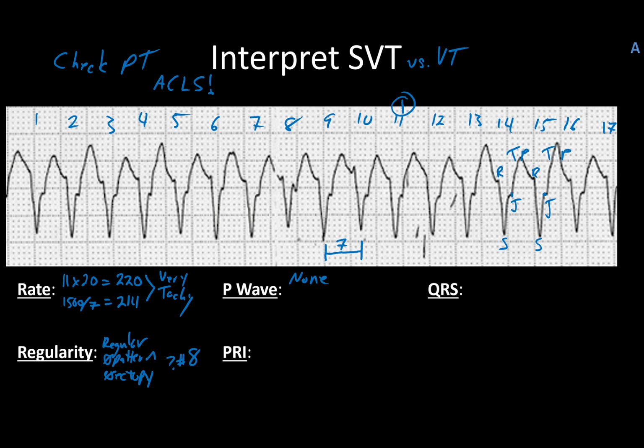However, if you look closer, there is some evidence of P waves that do poke their head through. And that's going to be this one here, this spot here, a little bit there. You could maybe argue that one, and probably again either here or here.